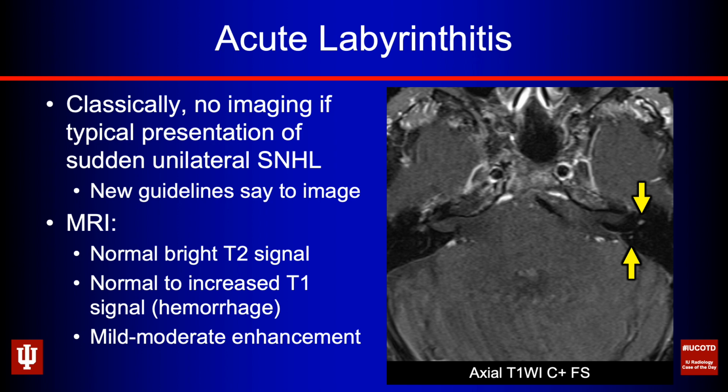It may be mild to moderately enhancing, sort of in the acute phase. Now, there has been some buzz about this over the last probably 3 or 4 years of doing 3D FLAIR imaging both without and with contrast, because FLAIR sequences have, of course, a T2 weighting, but they also have a component of T1 effects that go into them. And so it's sort of the proverbial turn it up to 11 on the amp. Whenever you give contrast, if you have pathology that intrinsically has bright FLAIR signal, if it enhances, it may push it up just enough that it increases your conspicuity.